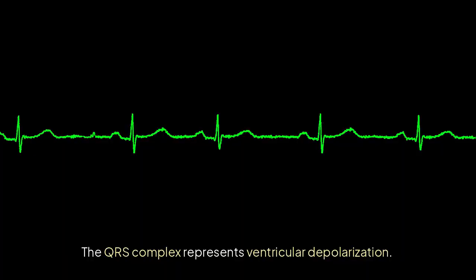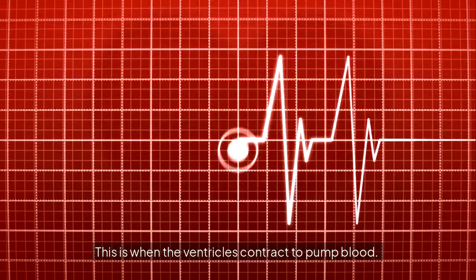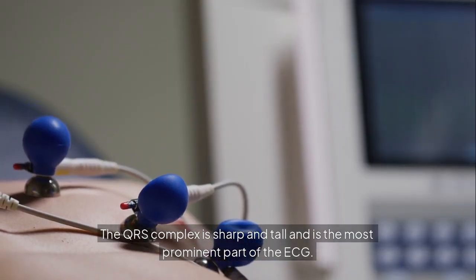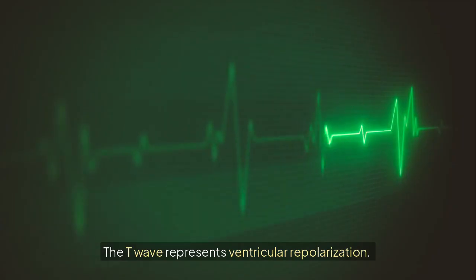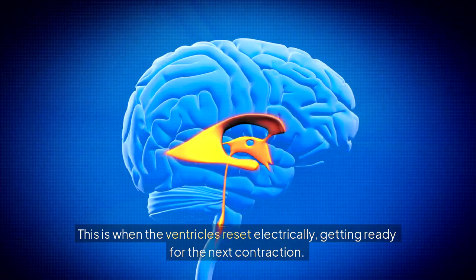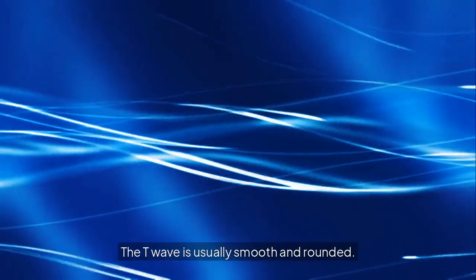The QRS complex represents ventricular depolarization. This is when the ventricles contract to pump blood. The QRS complex is sharp and tall and is the most prominent part of the ECG. The T wave represents ventricular repolarization. This is when the ventricles reset electrically, getting ready for the next contraction. The T wave is usually smooth and rounded.